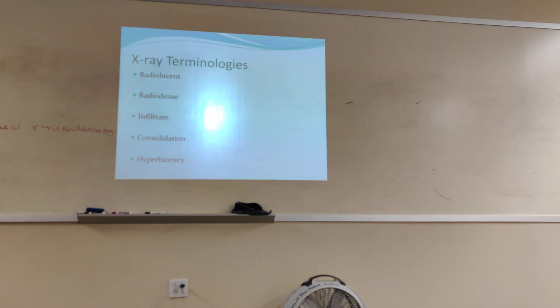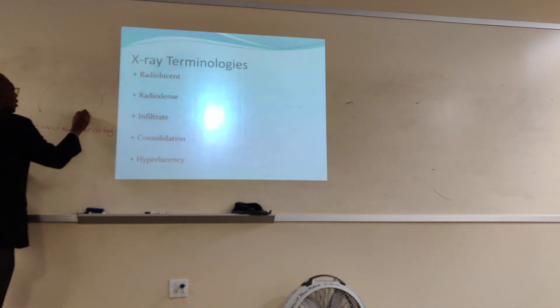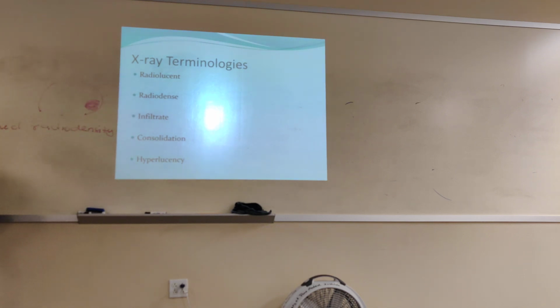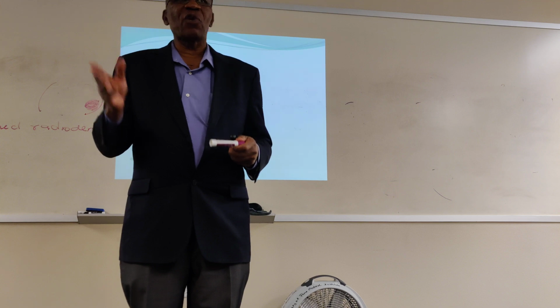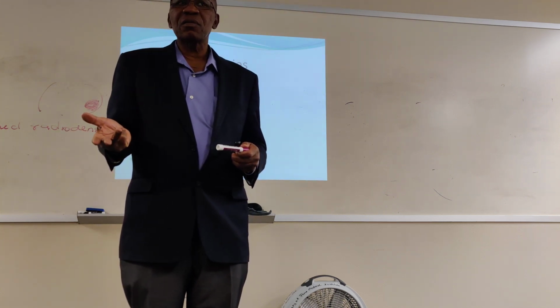Now, consolidation does not mean anything. Consolidation just means that there is a thick white area in the chest film. It is worse than infiltrate, but I don't know what it is, because a lot of things can cause consolidation on a chest film. For instance, pneumonia can cause consolidation.